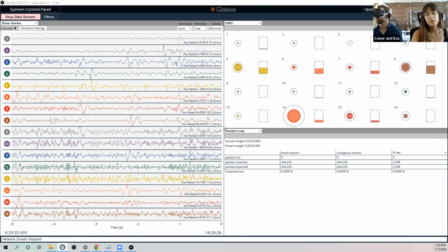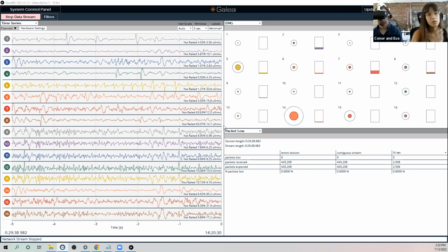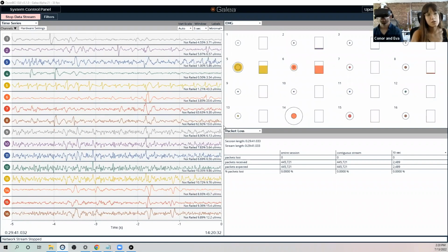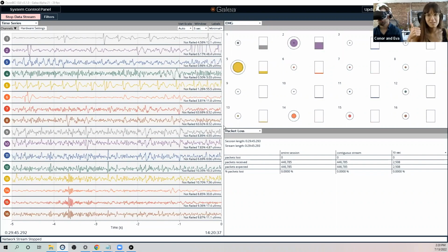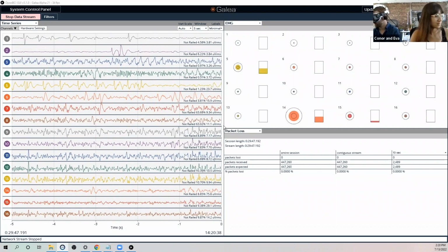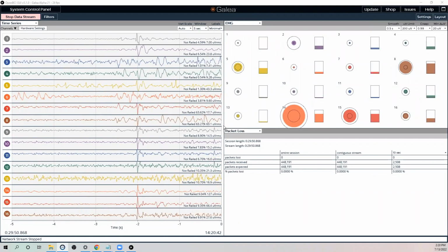Cool. I also opened the packet loss widget so that you can see the second session that we ran, which has been like 30 minutes, is also 0 packets lost. Great. Wow, we've wasted the time. We're already 80 minutes in, huh?